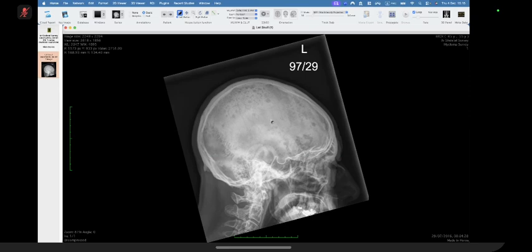So keeping in view the age of the patient, my differentials would be METs versus myeloma. Since the density of the cervical vertebrae on this particular radiograph is also somewhat osteopenic, I'll consider multiple myeloma as well, and would like to screen the patient for myeloma as well as METs.